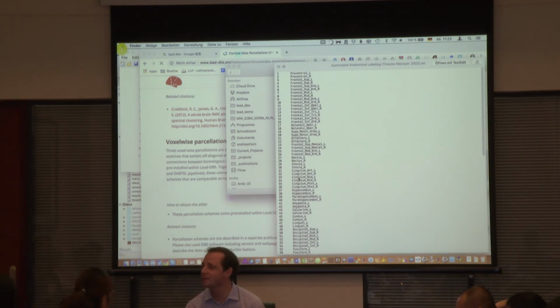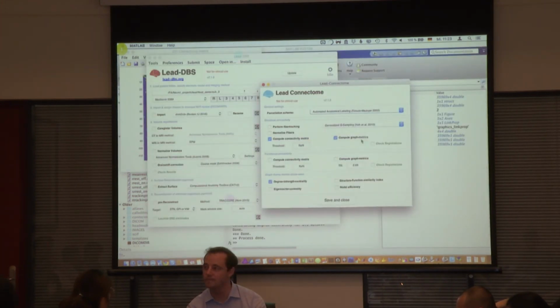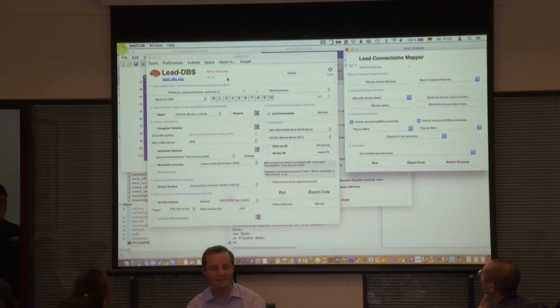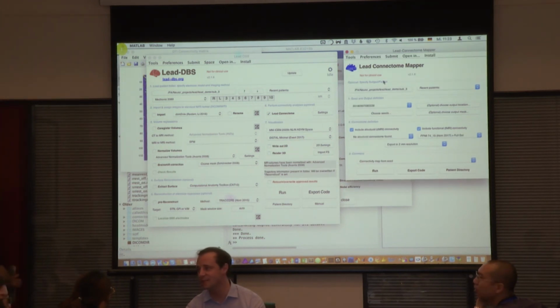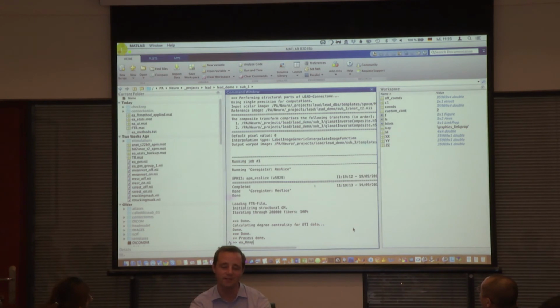And how do you get from there to the connectivity profile that you are showing us? You mean the connectivity matrix, or? No, the profile for the connectivity with the colors. That's somewhere else. That's actually in the mapper, which we will cover later. And plus scripts, so you would actually need custom scripts to do it. But it's all in here, it's easy. So it's basically the AAL map, and then you feed in your data.